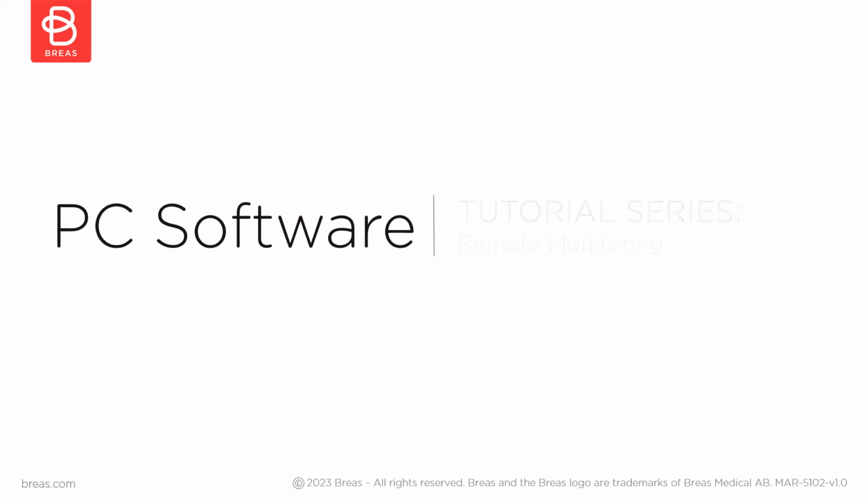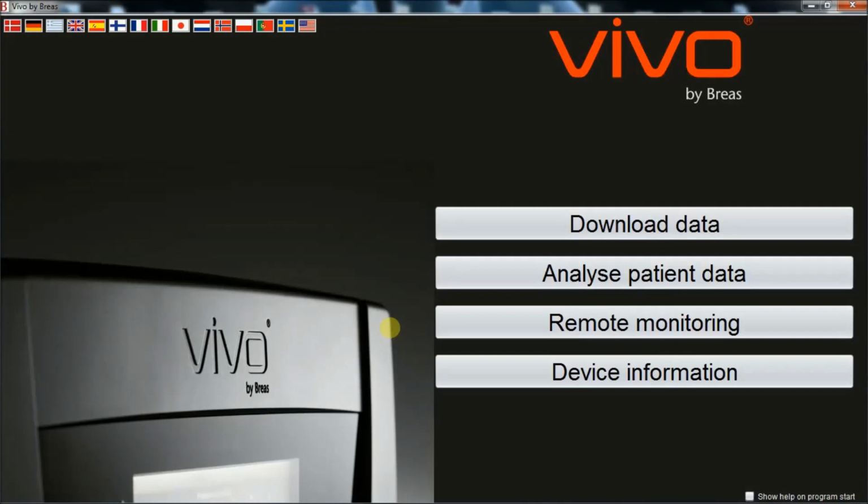In this video we will show you how to use the remote monitoring function of the Vivo PC software. With the Breas Vivo PC software we offer a best-in-class and easy-to-install solution for the remote monitoring of your patients.